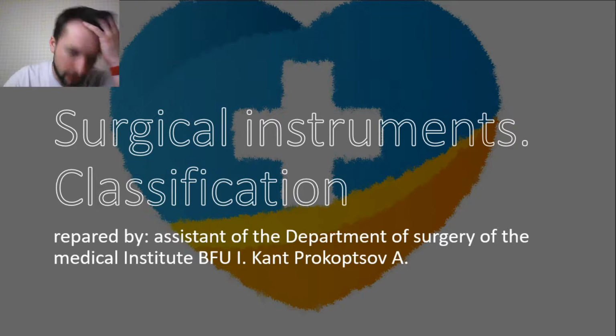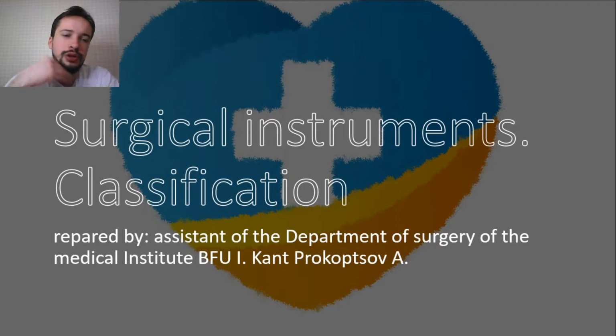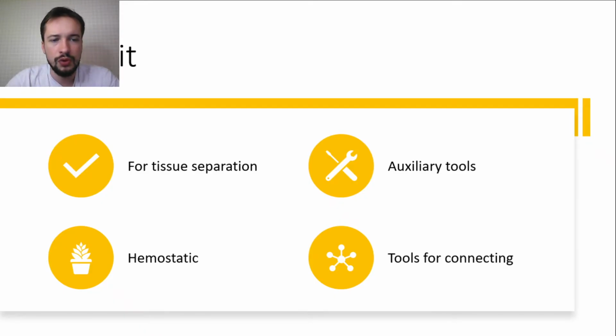Hello guys, today we will talk about instruments, and you will have many lectures, many videos about this topic. Today you can look at these lectures about the classification of many instruments.